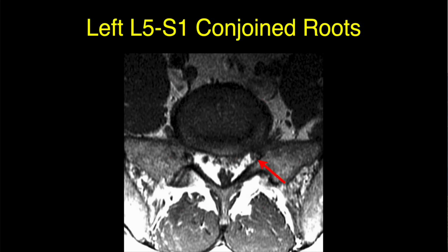So this is called a conjoined nerve root. That's when two of the nerve roots are kind of fused together on one side, and then typically the upper one is dragged down a little bit, the lower one is dragged up a bit, and they're a little bit late getting out. And it can be a problem if the surgeon doesn't know about it, because there's a little increased risk of damaging one of the nerve roots if they're not aware of a conjoined nerve root on one side. And it's a little bit controversial, but some people feel that it can actually cause symptoms. Okay.